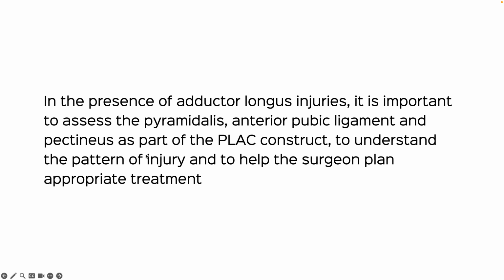And so to summarize, once we see adductor longus injuries, partial, acute, maybe sometimes subacute, chronic, we need to assess the pyramidalis, not the rectus, the anterior pubic ligament, and the pectineus in sagittal and coronal planes.